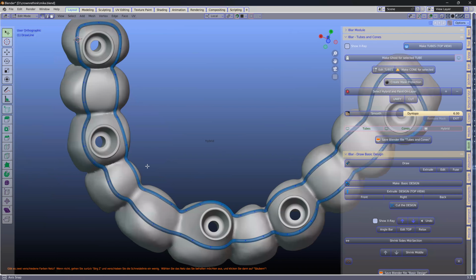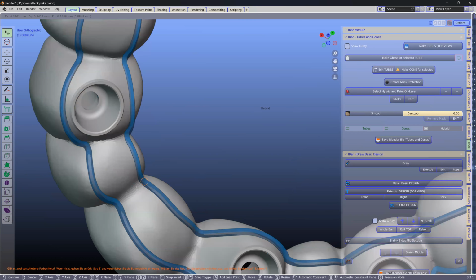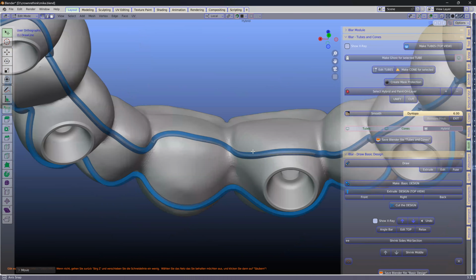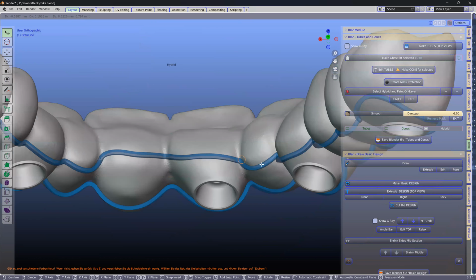Now, you've got to make sure that you've got enough space between, because otherwise you're going to end up with a very thin structure. So if I measure from here to there, for example, it's only 4 millimeters. So once we extrude it up and we're trying to angle it, how much do we have left? Does that make sense? Yes, that's correct, that's exactly my thought as well. So if you bring that up, we're going to end up with more space.